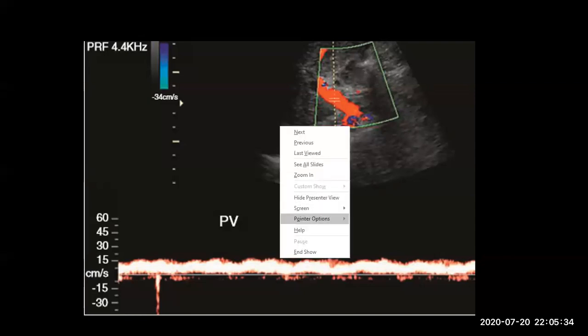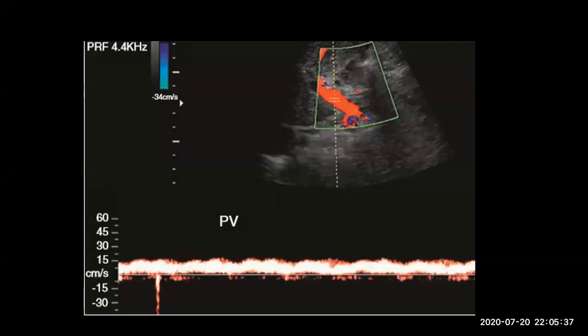Normally how much? Normally the portal vein velocity is around 15. It is a normal velocity. And the wave is normal or abnormal? The wave of the portal vein spectrum, is it normal or abnormal? It is monophasic, undulating, showing respiratory phasicity.